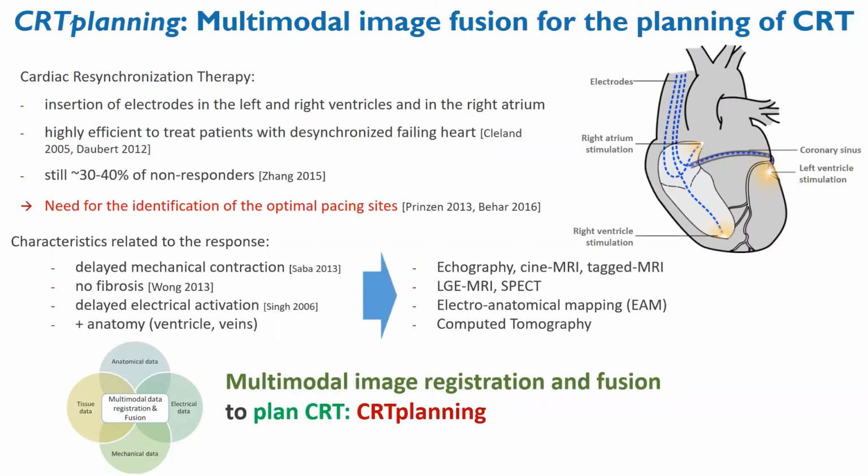And so there is a need for multimodal cardiac image registration and fusion to plan CRT, and this is the goal of the software CRT planning.